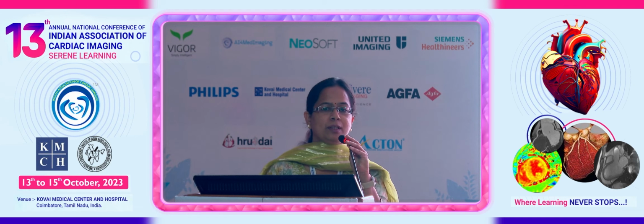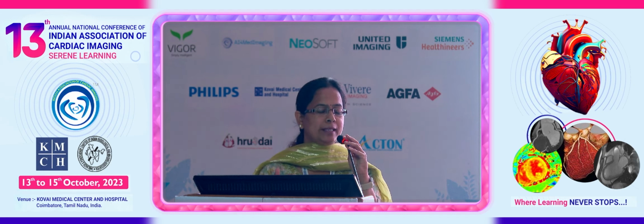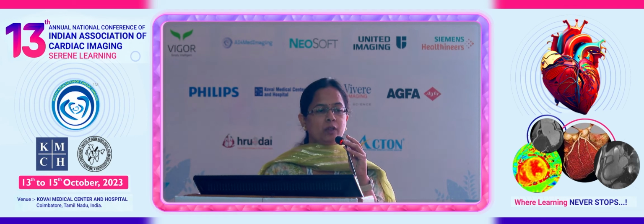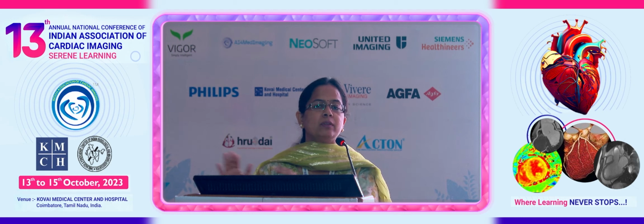The case was actually intended for beginners and starters, and to emphasize that CMR has a very important role in apical HCM. You might not have a full degree of apical ballooning even with a cavity obliteration, because the morphology of the papillary muscle and the subvalvular apparatus might be different in different patients. So we can have a spectrum.